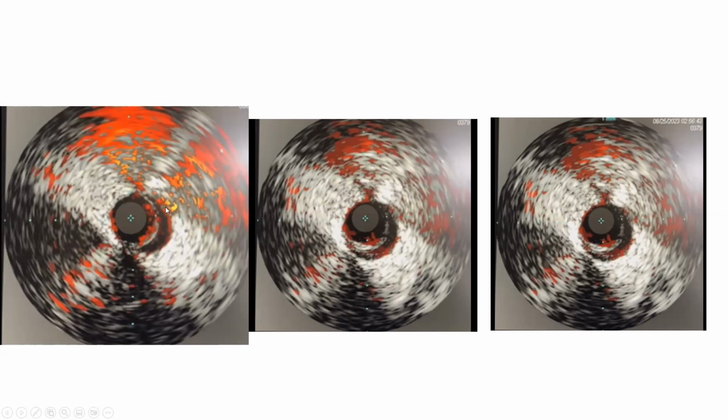So if you're doing CTO and you're going behind in the false lumen, your IVUS catheter will be here in that banana shape, and you will see usually that intima, it will look white because typically it's an occlusion. So you'll see your catheter here, and you'll see a thick white plaque or band that you're pushing to the side. That's how being in the subintima will look like.